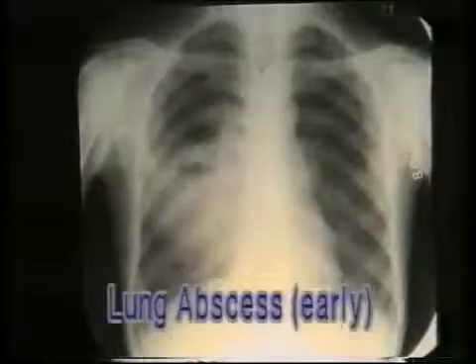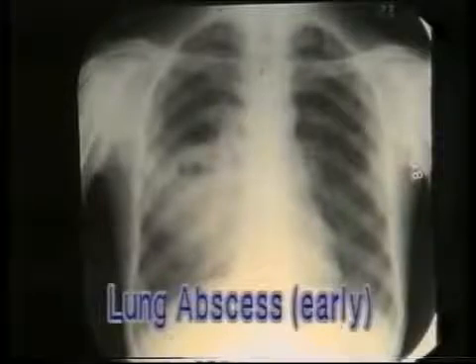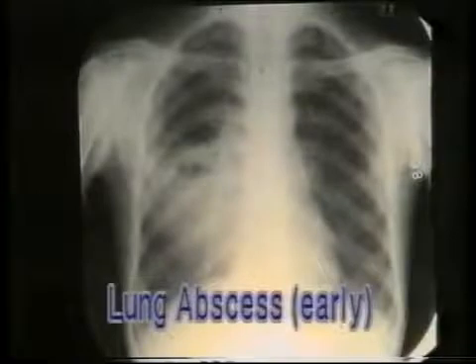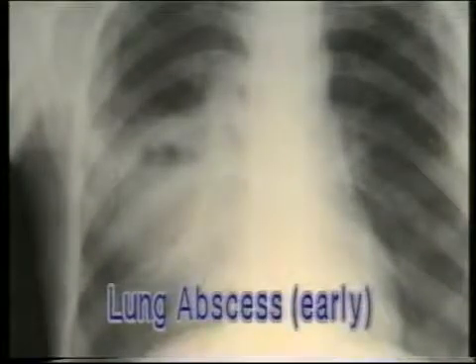A lung abscess develops in a patch of consolidation, that is pneumonia. So at the very onset, we have a patch of consolidation, or there is a large segmental opacity without any fluid level. Then the characteristic air fluid level appears. Note the small air fluid level at the top of this patch of consolidation in the right middle lobe. This is an early lung abscess.